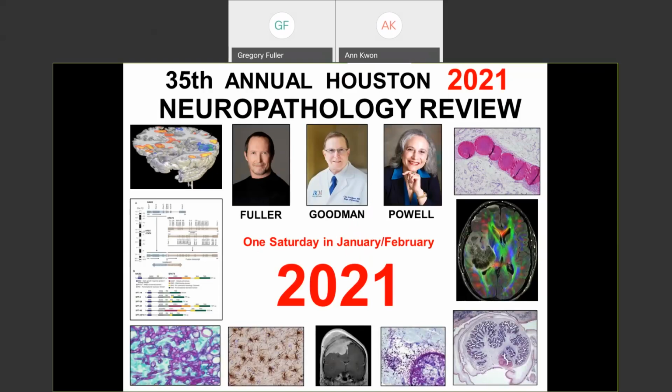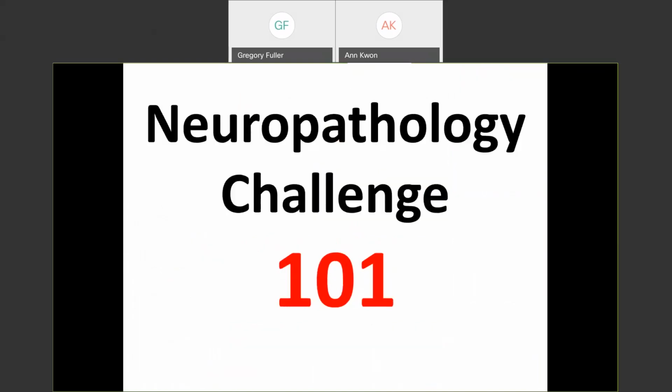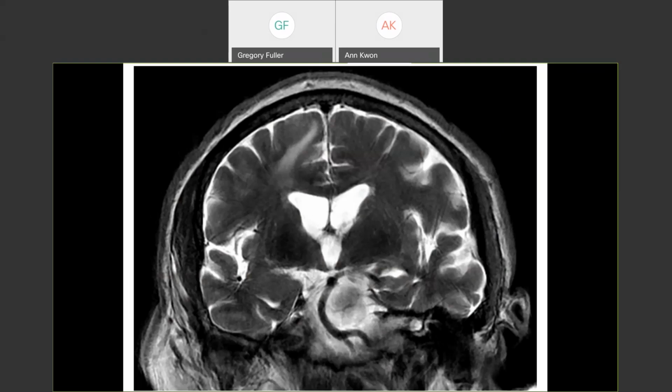Okay, here we go. Next case. Let's do a neuropathology challenge. We're doing all this imaging, right? Let's do a neuropathology one. We'll make it 101. We'll make it easy. What's your diagnosis? What is the neuropathologic diagnosis in this case?